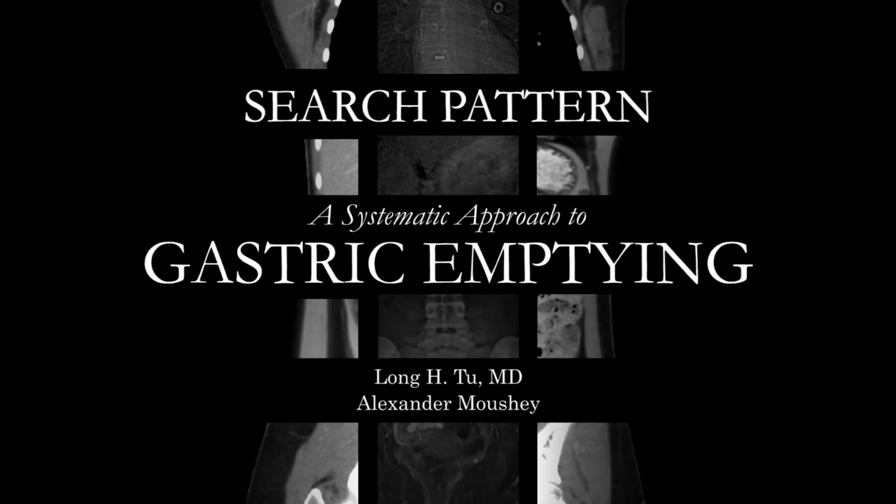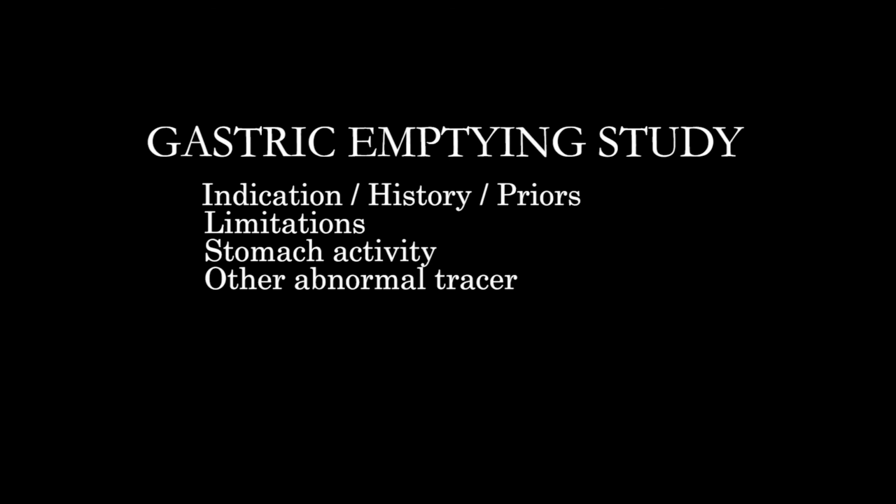All right, so today we're going to talk about a basic approach to the gastric emptying study. This is a pretty straightforward and generally not terribly complicated scintigraphic study. But it's been considered the gold standard to assess gastric motility and look for gastroparesis. And so this sort of study is done mostly in those circumstances. In some less common scenarios, we're going to look for overly rapid gastric emptying, which is another possibility.